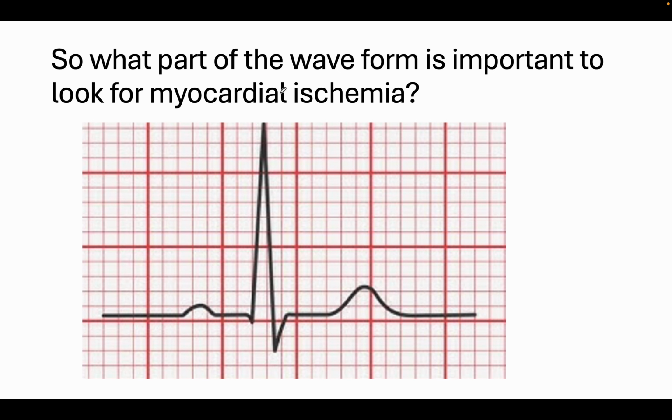So what part of the waveform in an ECG looks for myocardial ischemia? What should you be focusing on if our patient comes in with chest pain, for example? Well, the part that you're really interested in is this part here. This is called the ST segment.